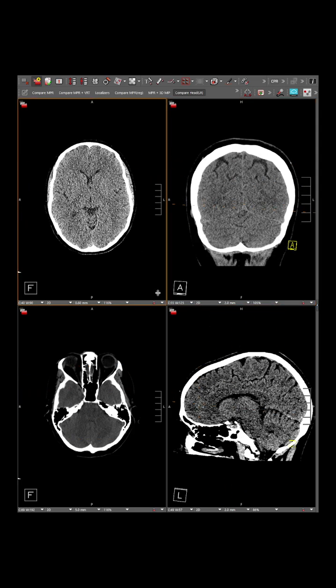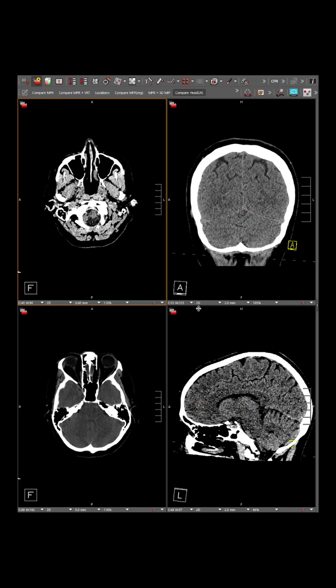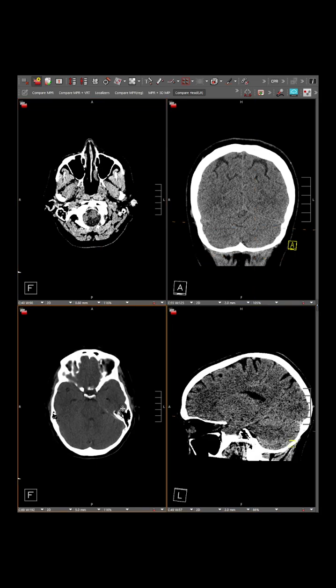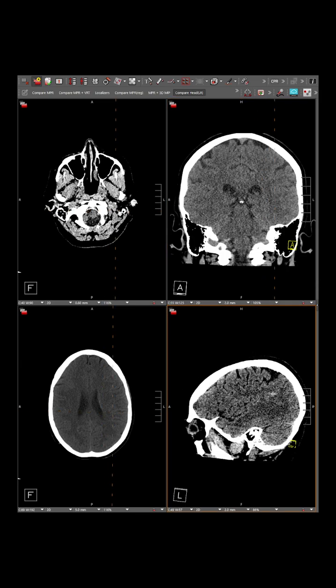Besides helping make sure that these axes are standardized in every single case, there are other advantages to using MPR. In truth, my workflow now is that for basically every cross-sectional imaging study that has thin images, or anything that I can reconstruct, I use that rather than the pre-made images, because we can get this and even better using an MPR.